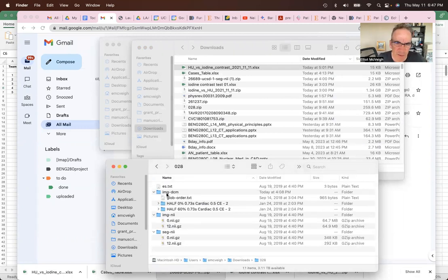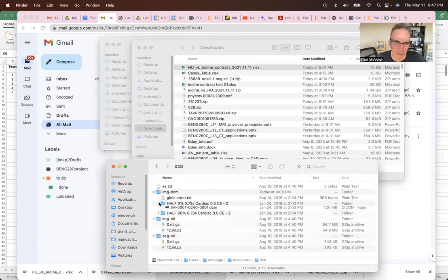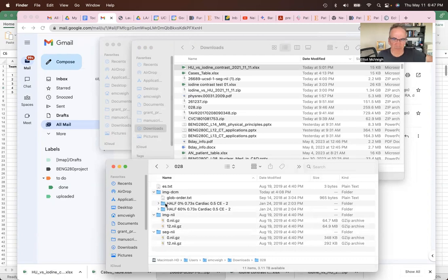There's a set of files, which are the DICOM files, which are the original images themselves. They're at a specific time frame. Obviously, there's one here. And so this is the 0% or at the QRS. This is 60% through the R to R cycle. And then for those 2 timeframes, we have images that have been converted to the NIfTI file format, image NII, and segmentations that have been done by hand by an expert. It looks like about 3 years ago.